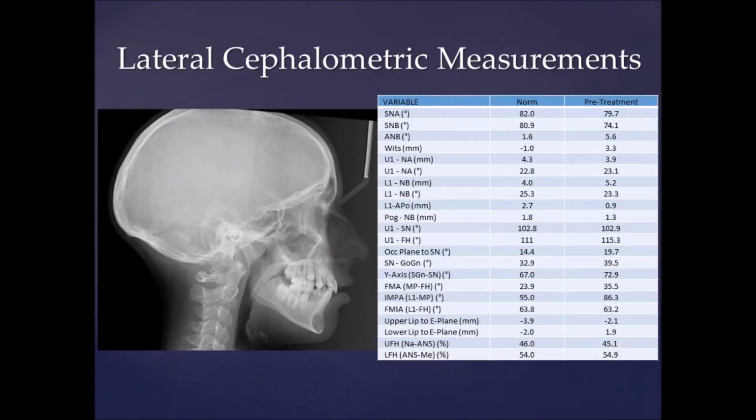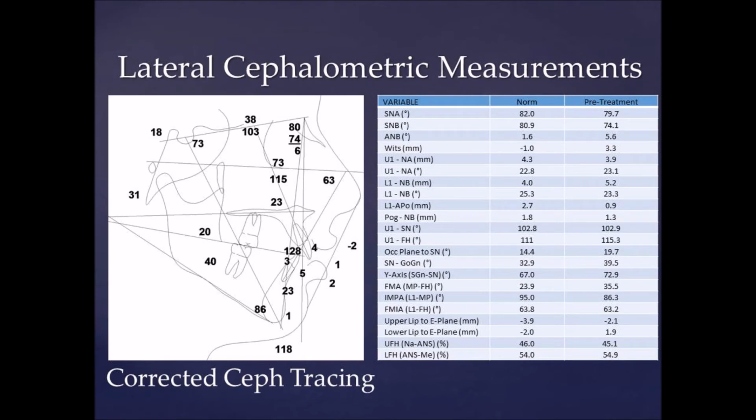The lateral cephalogram shows ideal overbite and overjet. This does not agree with the clinical findings of a 6 millimeter overjet, so the tracing of the lateral cephalogram was corrected for the mandibular anterior positioning. Overjet was set to 6 millimeters. The cephalometric relationships are as follows.